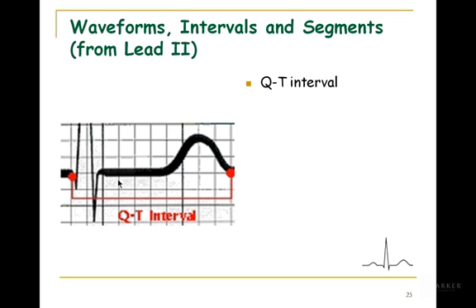For example, if you have hypercalcemia, too much calcium in your blood, it can shorten the QT interval. Hypocalcemia can cause a long QT interval. Okay? Now, in your notes, it may mention that the QT interval represents the time period of ventricular contraction. Not completely, because the ventricles don't really contract until we hit the peak of the R wave, but it does give you an idea about the time period of ventricular contraction, because you're going from R to here, the ventricles are contracting from that period of time.